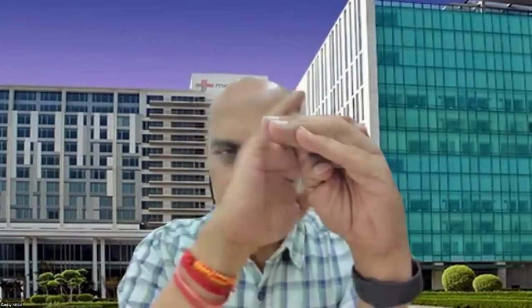Okay. A combination of the two is also possible, but usually what we have to understand is that dyskinesia is a motility problem. That means the shape of the ventricle would be preserved, but when the ventricle contracts, for example, the apical segments are akinetic in the four-chamber view, and this is the apex.